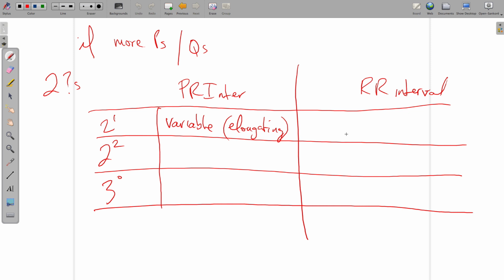The R to R interval in second-degree type 1 heart block is variable. Another way to look at this is that you have a dropped QRS. Another way yet to look at this is to say that you have grouped beats. Grouped beats. Really important. This tells us a lot of information when we can recognize it.